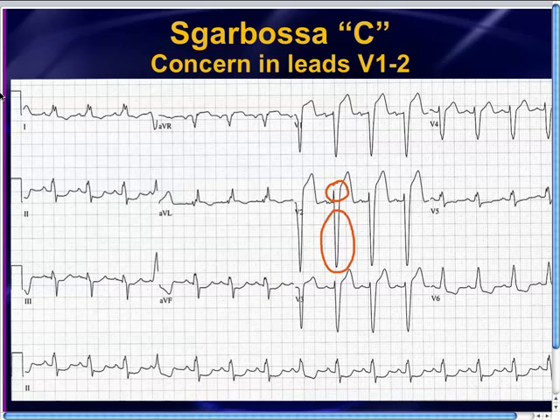So for example, in this case, the ST segment elevation is 6 millimeters. The size of the S wave is about 28 millimeters. That's greater than 20%. That means in this one lead that this patient's having an acute MI. And Dr. Smith said that this is more than 95% accurate as well. Unfortunately, that study, to my knowledge, hasn't been validated yet, but hopefully it will be, and we will be able to use that eventually as well. So that was just a little bit of a digression into something a little bit more complicated, but very promising.